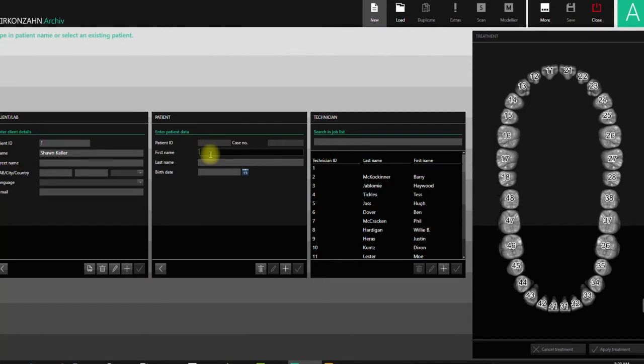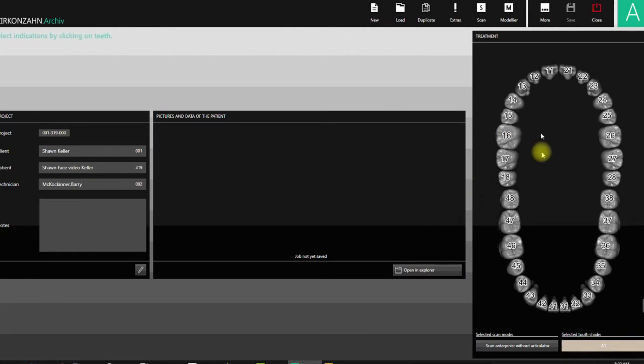And we always try to name them like this. Sean. And then say what you're doing next. This is face video. But if you were making a bridge, you would say upper bridge. Upper same day new smile. We put that as like the middle name kind of. And then last name Keller. And then check. And then this is the lab tech. I think I will actually give you guys your own names in here soon and get rid of all these cruddy ones. So check.